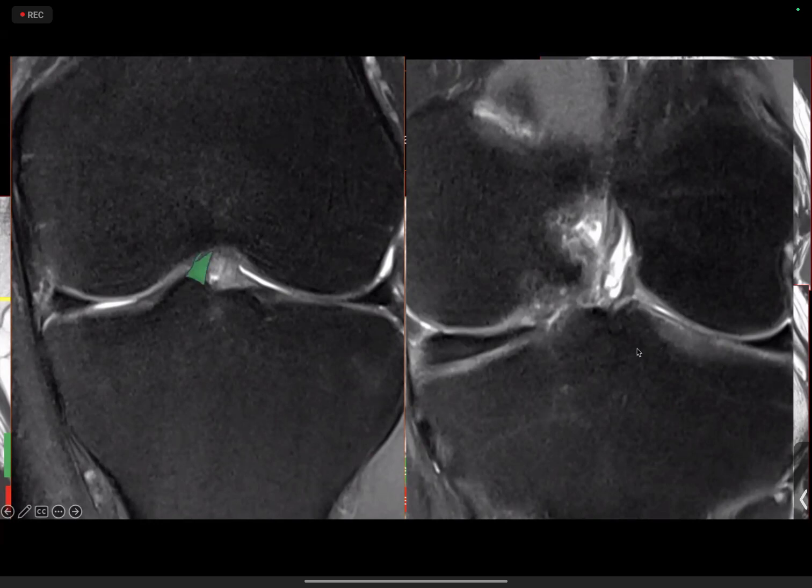This is the AMB, seen in a slightly more posterior section, and the PLB, which is the PL bundle, which is seen slightly more after one or two sections, and then it would be appreciated better again when we go slightly more inside the knee joint. Here, if there is some separating tissue, edema, or congestion of the vascular channels, those two bundles would appear split and they would be appreciated better.